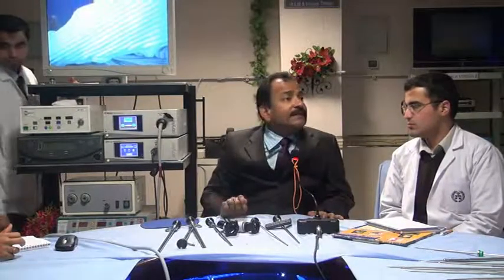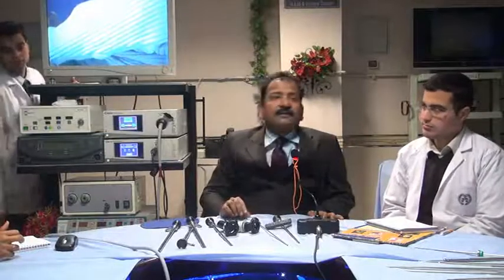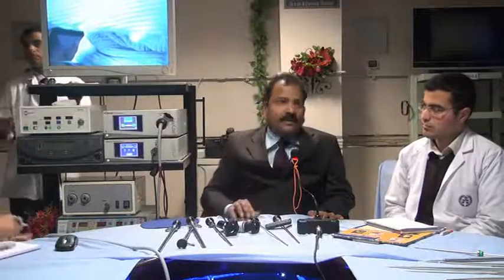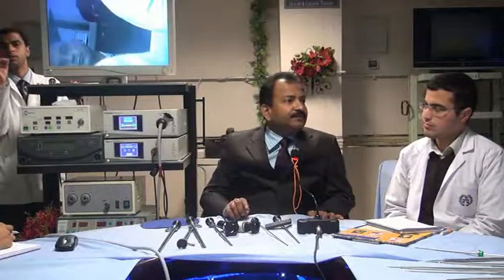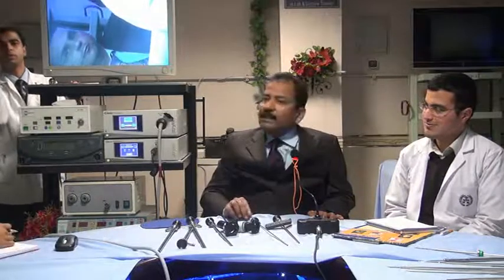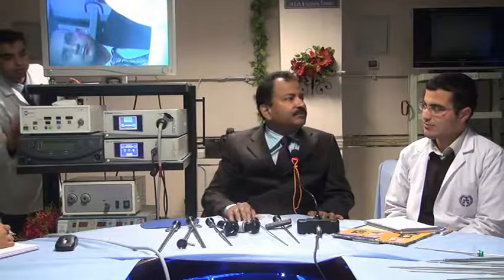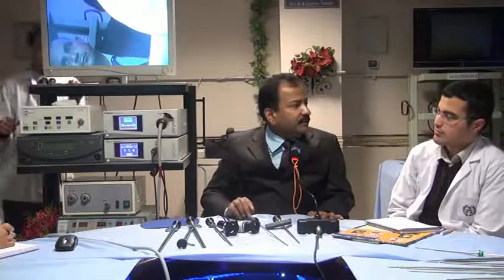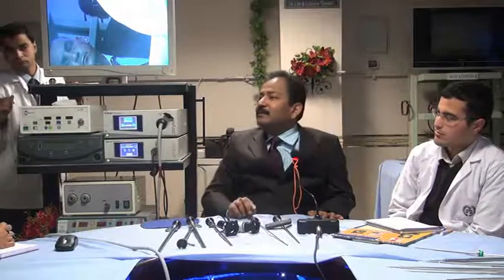That's why red color is used all over the world as a danger sign, because even in less light, red comes immediately. So, if bleeding starts, then the single chip immediately deteriorates in quality. Everything is red. And at that time you will see the real benefit of having the 3-chip camera.